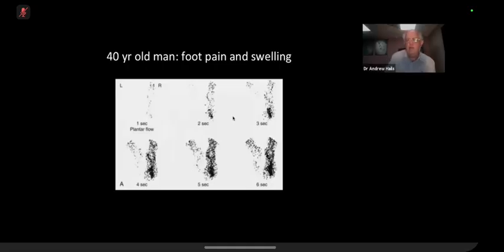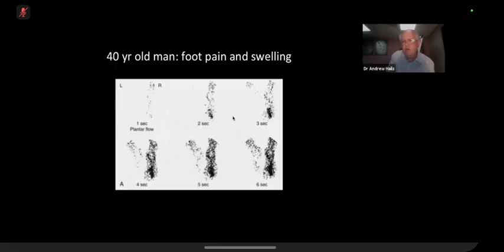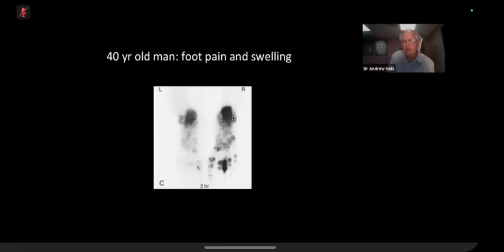Yes, and again, what kind of bone scan is this, where you get the 3 sets of images? It is a triple phase. Yes, that's right. Blood flow, blood pool, and delayed bone phase images. So yes, it may be an infection, mightn't it? He said osteomyelitis. I think that's quite possible.